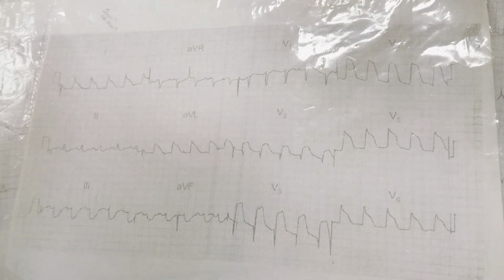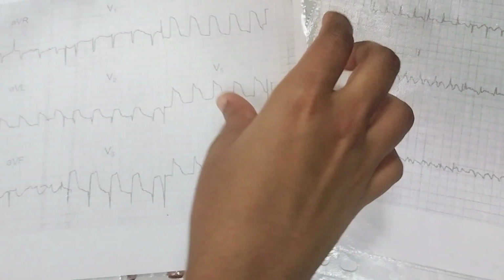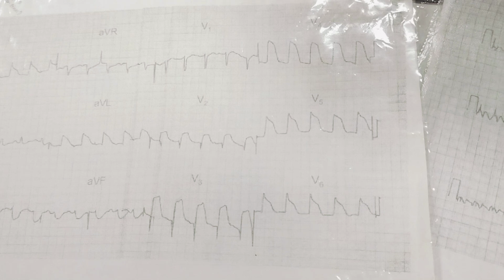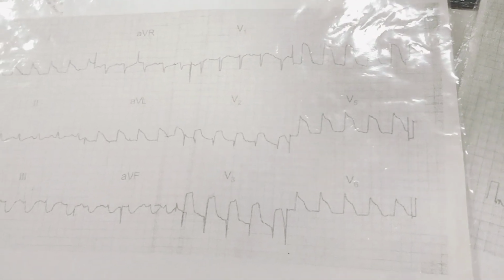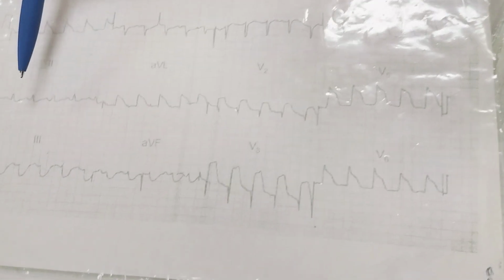ECG Made Easy by Hampton is a book on the basics of ECG. These cards are from another book, the Atlas of ECG by Hampton. There are many different cases in this book.